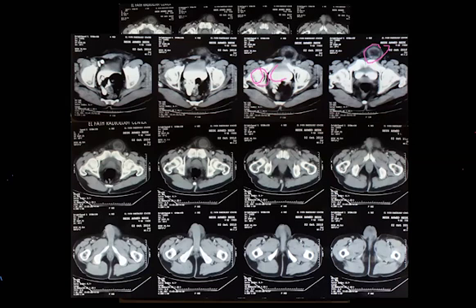يلا ورينا الفيمورال vessels. The femoral vessels are clearly seen in this image. Where the femoral vessels. ما شفتش لسه. انت علمتي على نفس الفيلم ولا؟ لا، على الشمال. مكارة ما عنديش اي افلام اتعلمتي على دول الفيمورال فاسلز تفتكري؟ لا شوفي راجعي نفسك تاني. ايه دول تفتكري؟ دول الفيمورال فاسلز كده.